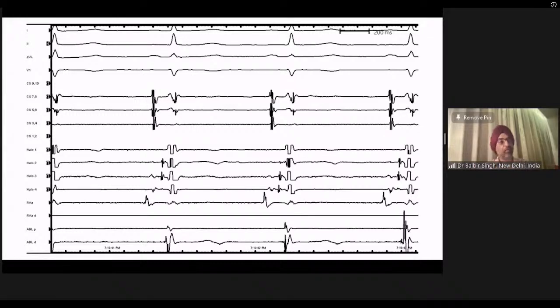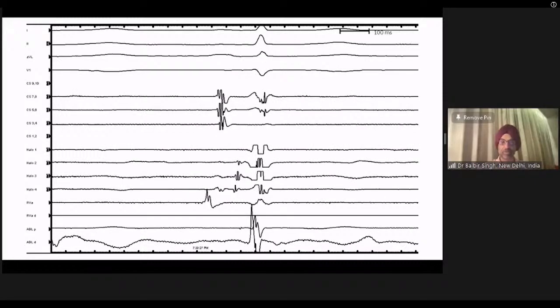Now, with this, we come to the conclusion that we are dealing with something which on atrial pacing reverses the sequence. So that means atria is a part of the circuit. So when you pace the atria, you get LBB morphology complexes, which exactly match the left bundle tachycardia, which reverse the sequence of His bundle activation, telling you that this is a pathway which needs atria, particularly right atria, because you get this on right atrial pacing, not on CS pacing.